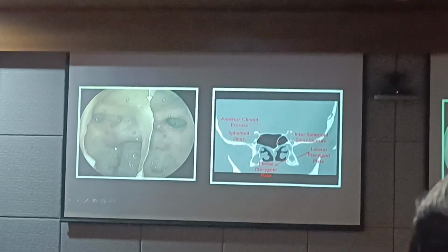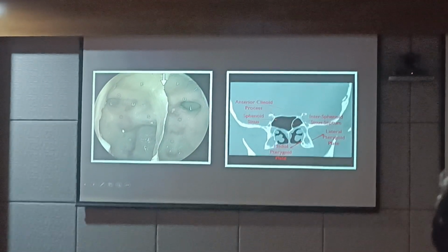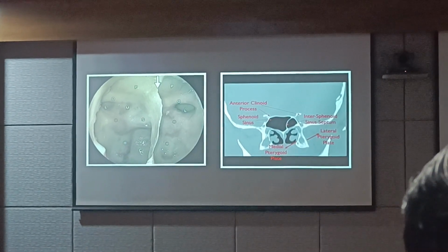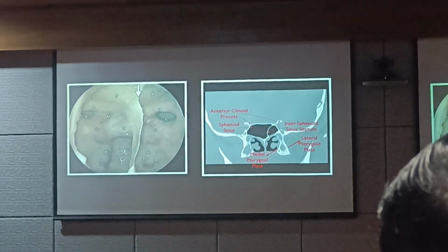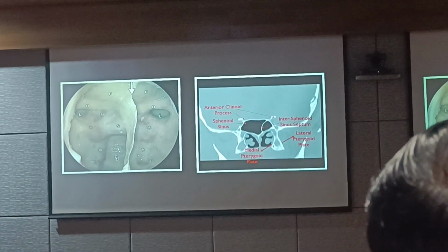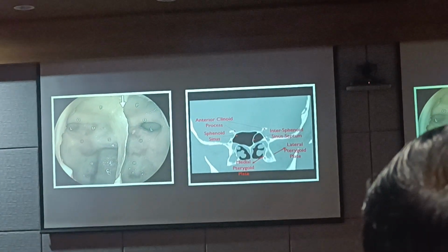It comes forward over here. That's why I said this is an anterior bend. It comes forward. So if I am the carotid and y'all are operating, this carotid is not going to be like this. Carotid is going to be like this. So this paraclival carotid comes like this and turns. So this is like a cobra facing you. The sphenoid cavernous segment is more towards you than the paraclival segment. Got it? This is the way my carotids would be, like this. Is this clear to everyone?